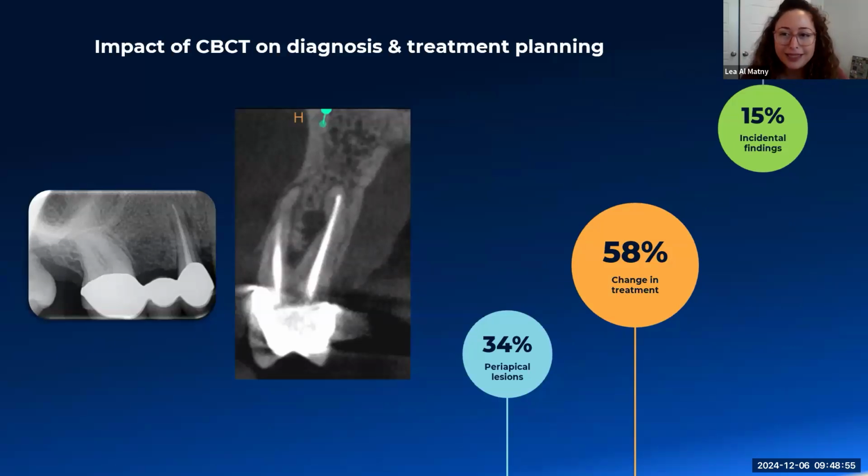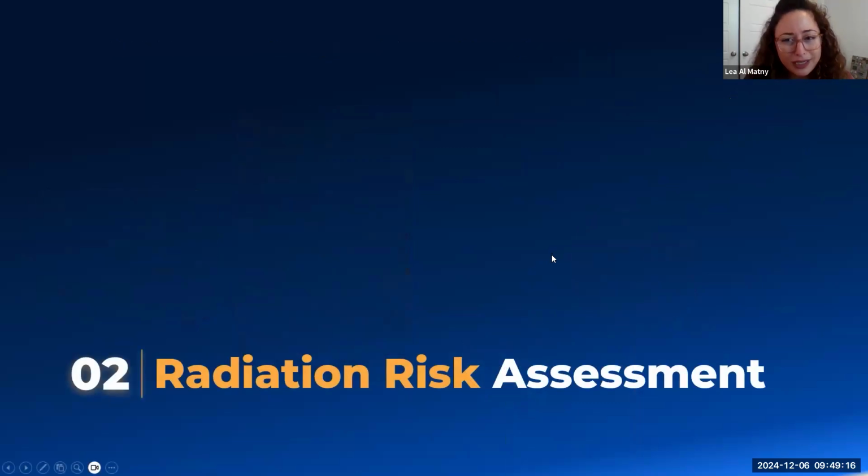Patients are asymptomatic, and it is very important to either monitor them or to treat them. So keep an eye out for them when you take a CBCT scan, because as you scroll up and down, you will see there's a small line, and it's usually not associated with a lesion. There are no symptoms unless it reaches the root canal space.